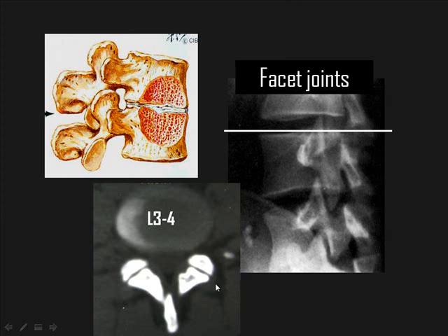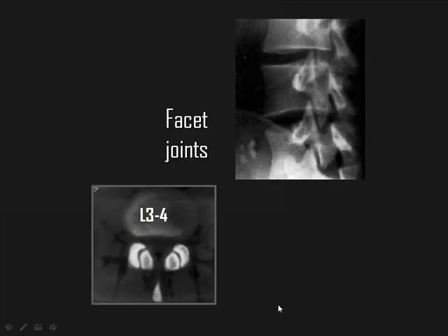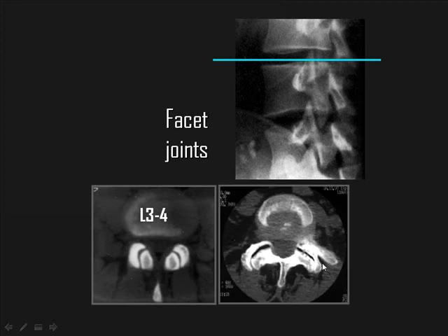What are you looking for in this articular facet? First, this articular facet is a bony structure. Then you evaluate in the bone window images. Then you look for, the only pathology here is osteoarthritis. And this is the normal joint, and this is the osteoarthritic joint.